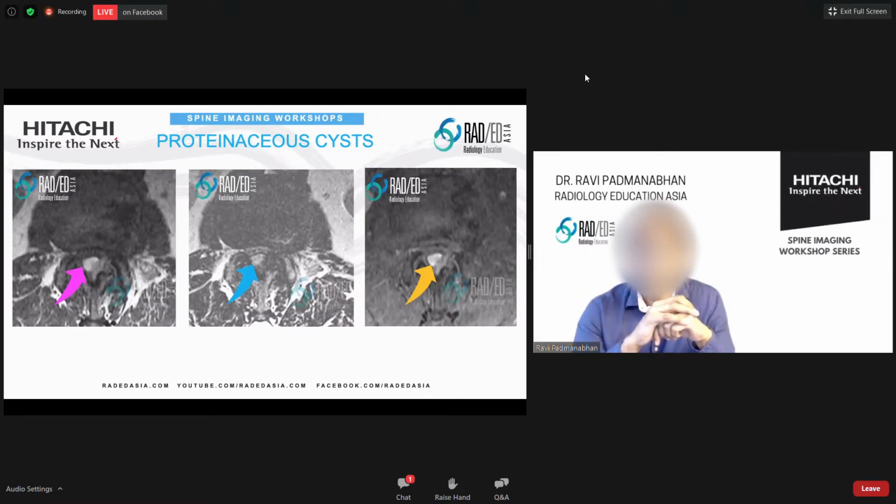So what we've said is that most cysts are going to be fluid signal. Okay, they're high signal T2, low signal T1. Occasionally you'll get some septation. But sometimes what you see are very proteinaceous cysts. So the content of the cyst has a lot of protein in it. What that does is that the signal increases. So here, this is a T1. We've got very high signal. T2, it remains high signal. So on this, it still just looks like a normal cyst.